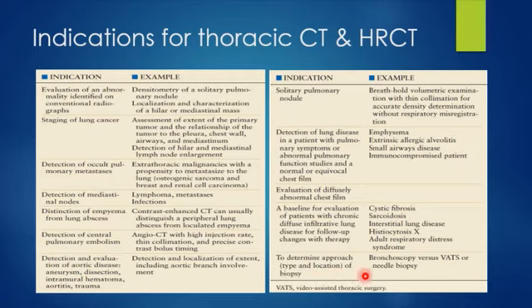Just keep in mind, for HRCT, high-resolution CT, it is done by having a thin cut, 1 millimeter or 0.5 millimeter, then leaving 10 millimeters, then another thin cut, then leaving 10 millimeters, then another thin cut, to reduce radiation exposure. This means we might lose focal abnormalities in the 10 millimeters that we skip. That's why it's indicated only for diffuse lung disease, like emphysema, interstitial fibrosis, bronchiectasis, things like that.